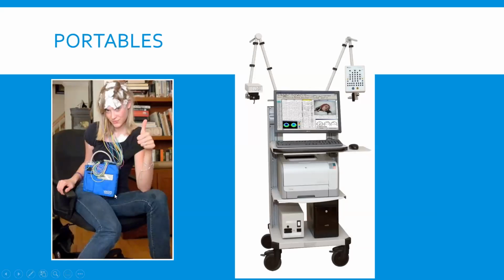And these are portable machines. This is an ambulatory EEG. A patient can take this home and wear it. And here, this is one of our portable machines.